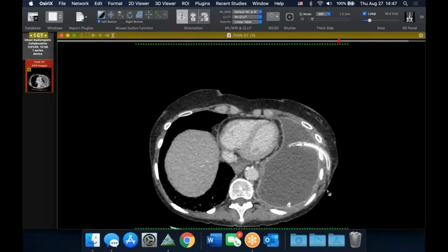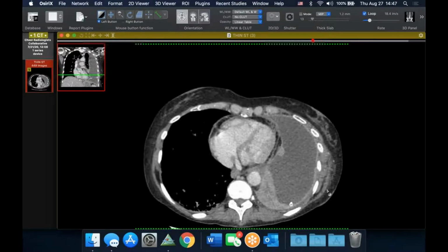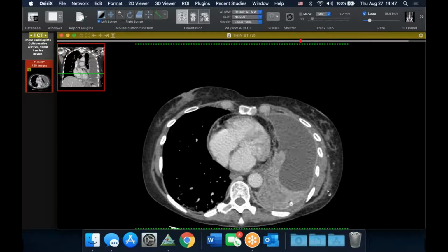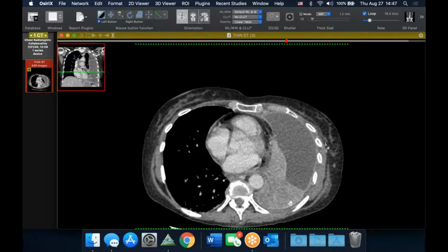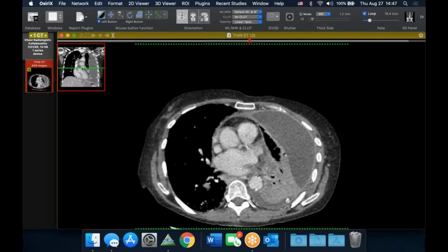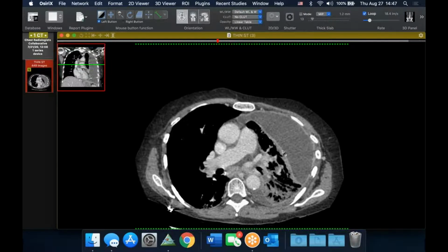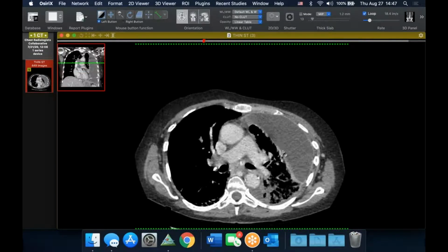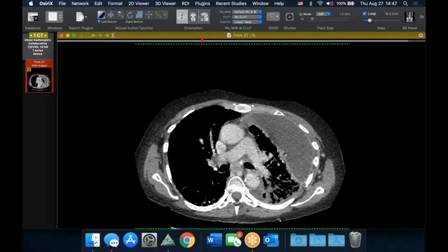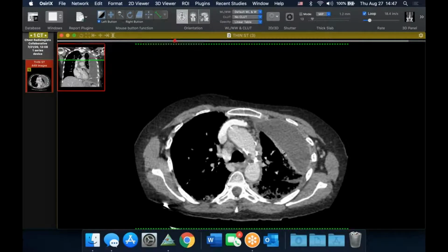But Jeff, did you say there was malignancy here, or was this all just? I believe this was a malignant effusion, hence the Pleurx, and I think this effusion must have gotten infected. That's why you have the empyema and this unhappy-looking lung. I don't remember the underlying pathology of it, but we don't typically put a Pleurx into an empyema. We would put a pigtail in or a large bore drain after they cleaned it out.